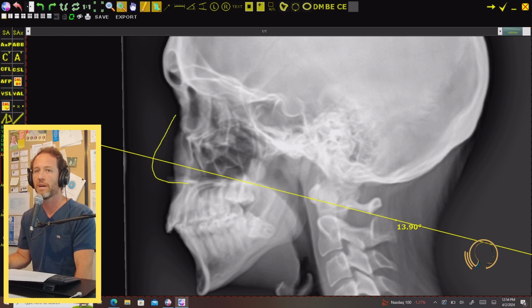So by way of review, you have S0 through S5, right? And S0 is through the lips. S1, bottom of the nose. S2, kind of bridge of the nose.